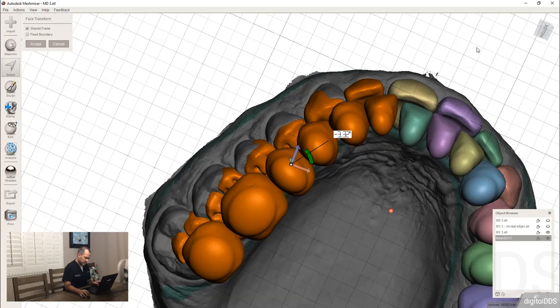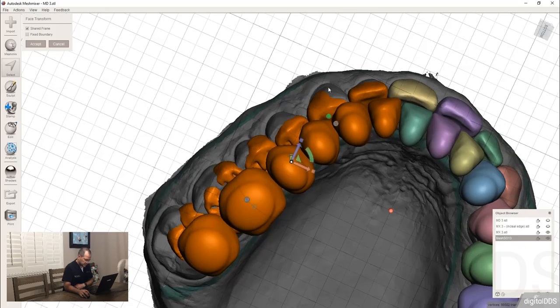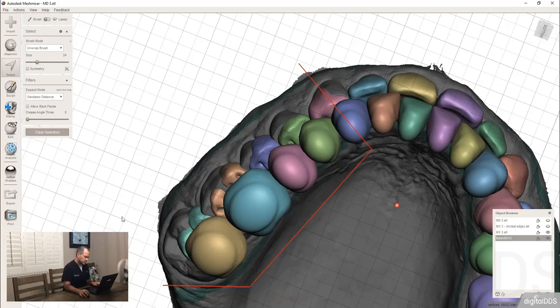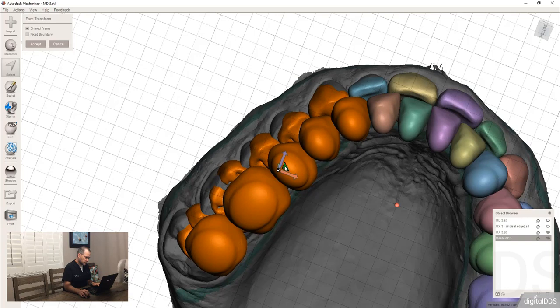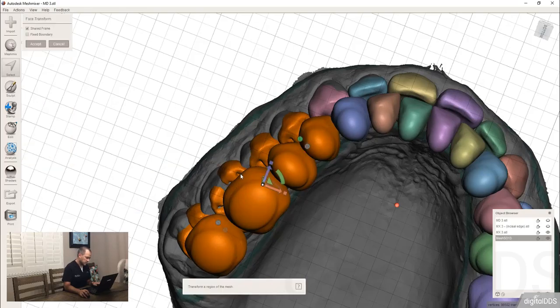Also notice that I click on the little arc, the pizza crust, but then I move far away to make those fine rotational movements. T. T again.